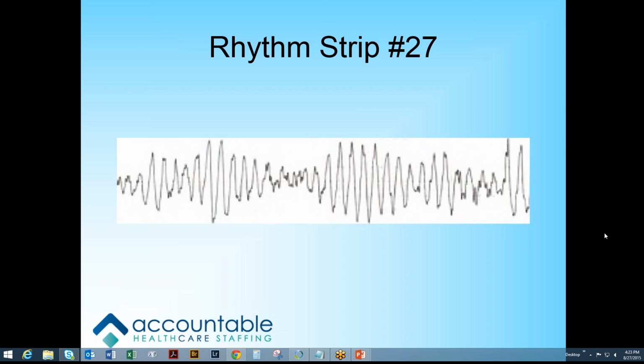Do we need to know how to do it that way, or is it fine just to count the QRS complexes like we've been doing? It's okay to count the QRS complexes as you've been doing. Just remember to stay within the hash marks. So let's say there are 3 hash marks going across. Make sure that you start within the beginning hash mark and the end hash mark. Okay. Thank you. You're welcome. Any other questions?